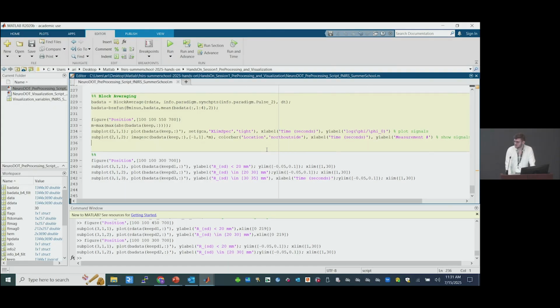Alrighty. Does anyone have any questions? Does anyone want me to run through the pipeline with different filter cutoffs? I'm happy to take suggestions here. Yep. I might be skipping ahead, so stop me.